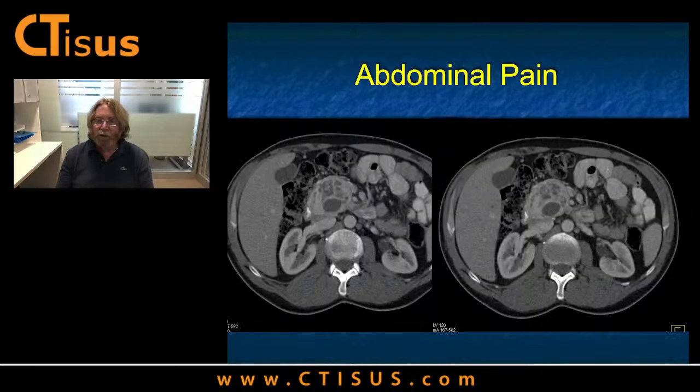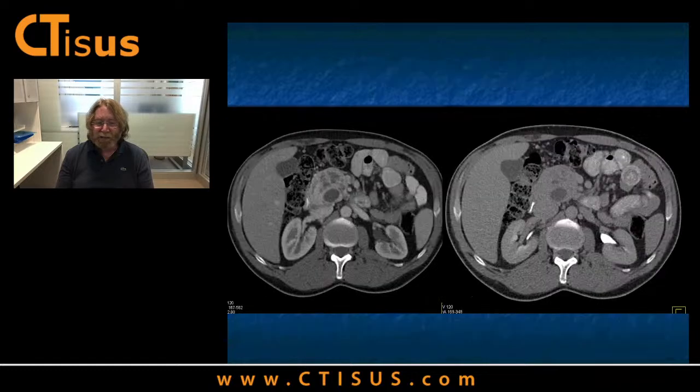Okay, another example, abdominal pain, and there's a pancreatic mass. The mass is cystic, but this thick wall is not a lymphoepithelial cyst, obviously. It's not a serous cystadenoma because the walls are too thick. If this is an IPMN, then it has malignant transformation. If this is an MCN, then I'm thinking about high-grade dysplasia. It doesn't look like a serous cystadenoma. Well, what could this be?